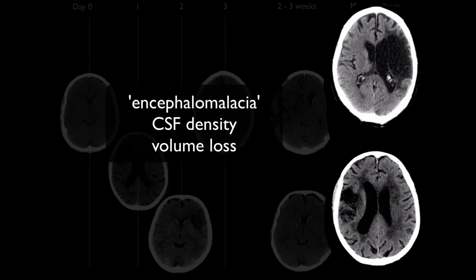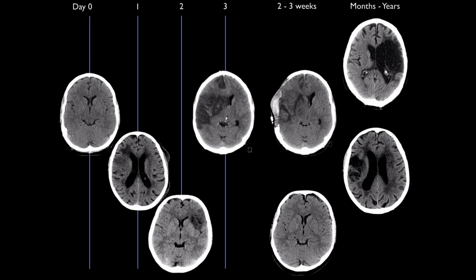It is important to note that the size of the infarct, therapeutic interventions and patient factors all influence exact timing. At either end of the process, the appearances and timing are predictable, but during the subacute phases, exact aging of an infarct can be difficult.